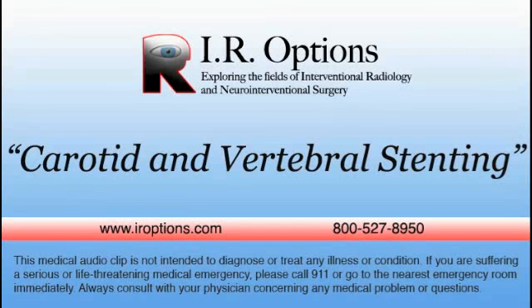Carotid and Vertebral Stenting. As an individual ages, the arteries of the neck and head can fill with plaque deposits caused by atherosclerosis, leading to a narrowed vascular segment known as a stenosis. Heredity, hypertension, high cholesterol, smoking, and diabetes can all contribute to their formation. No small thing, seeing how these blockages can result in blood clots and stroke.